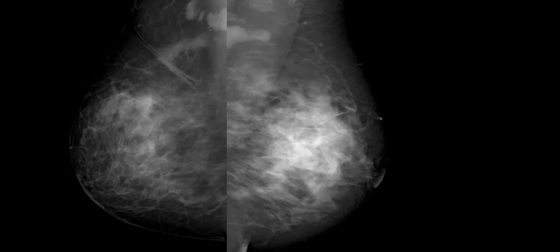Why do you want to do compression in global asymmetry? To detect whether it is real. Here almost the whole breast is occupied by this global asymmetry, not only a quadrant. So ultrasound here, yes, and there is a palpable abnormality, so I will go for ultrasound.